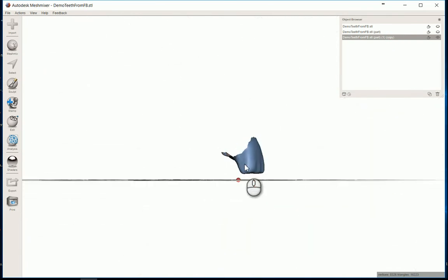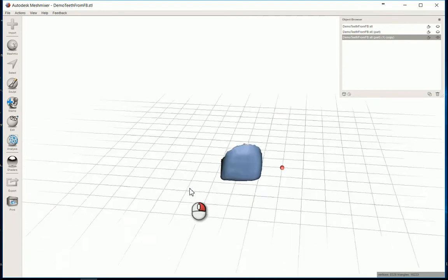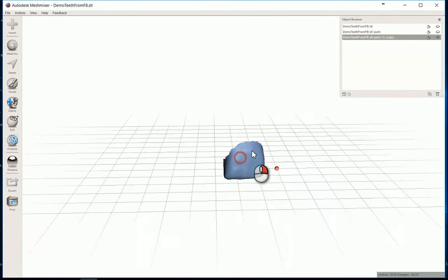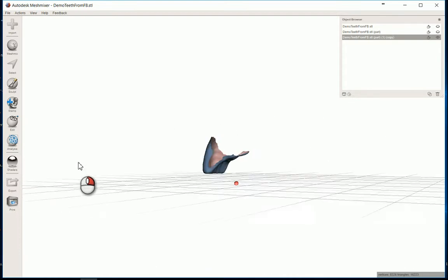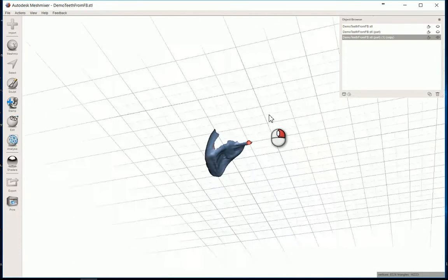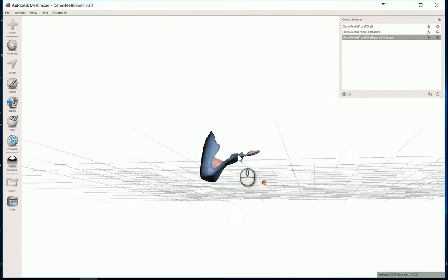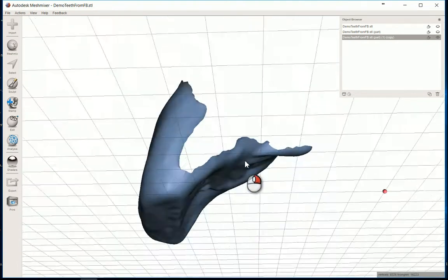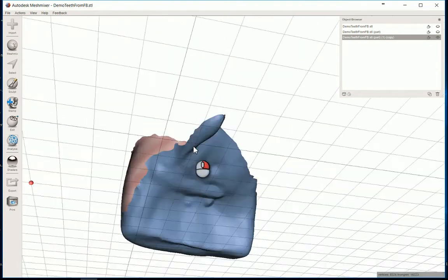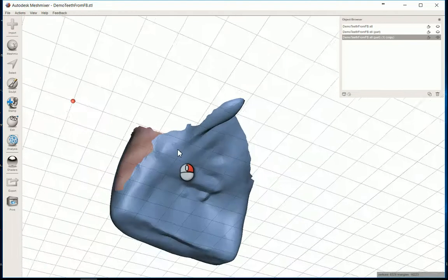What's nice is we have the mesial aspect of this tooth already selected, so that's nice. But unfortunately, and this is going to be the case almost all the time, on the interproximal region here, the contact area is going to be missing. And it's problematic if you try to do a fill or something like that. That gives you weird surfaces.